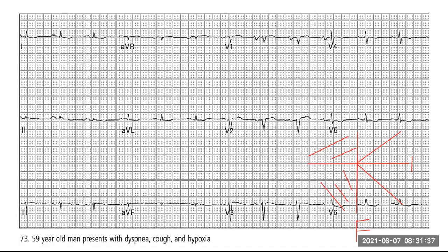What do you think? Okay. Pointing downwards, eh? Yeah, it's mainly pointing downwards, right? Or you could say even biphasic if you want to be technical. But if you really look at it, the majority of it is pointing down, right? So if this is AVF at the bottom, that means electricity is moving away from it. Remember, you can use any method you want. I'm just showing you a simple one, right? So we know we have a left-sided axis. At least we've got that part out of the way.